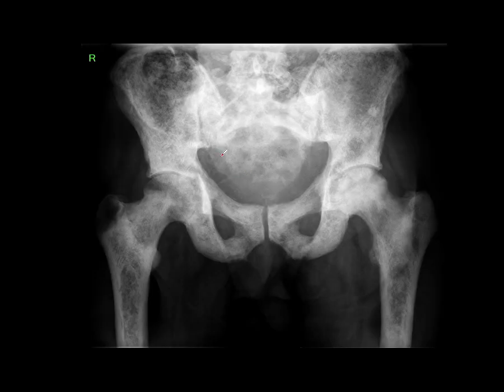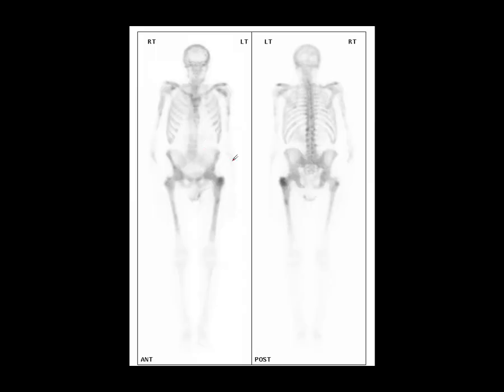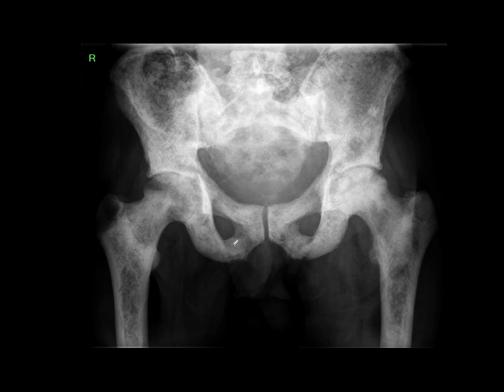So the patient we've just seen here, I'm just going to show you his plain X-ray just to show you how grossly abnormal it can be, and this is the usual appearance that you'll see in a superscan if you should care to do a plain radiograph.